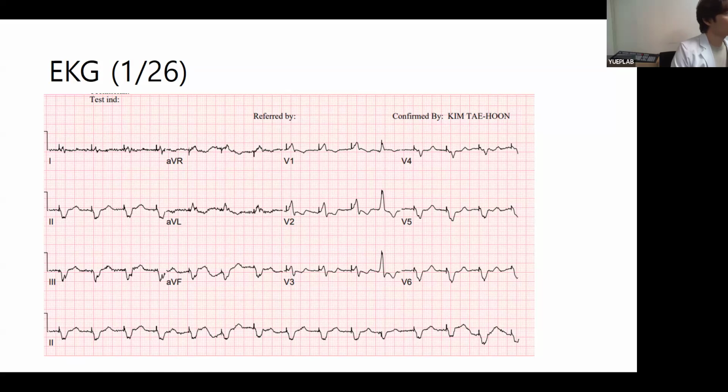What is the acceptable and what is the ideal ECG after CRT-D? V1 RBBB pattern is quite a good finding, but the more important leads are lead 1 and aVL, which reflect the LV lateral wall.